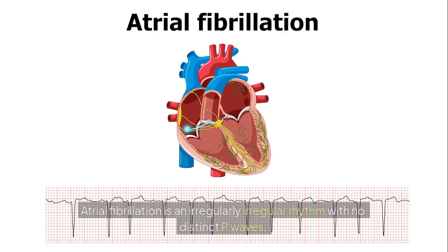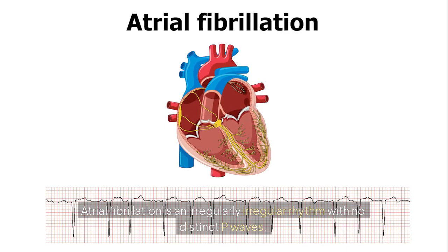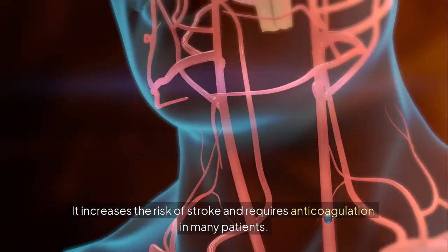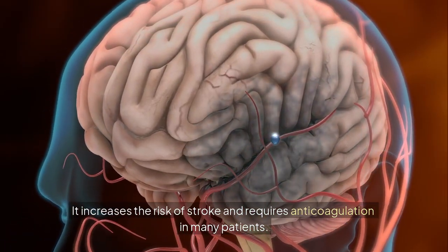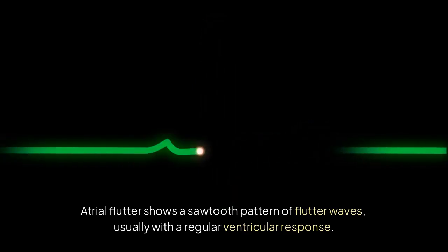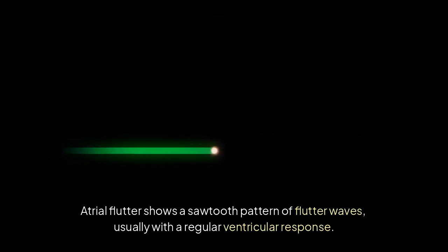Atrial fibrillation is an irregular rhythm with no distinct P waves. The baseline appears wavy or chaotic. It increases the risk of stroke and requires anticoagulation in many patients. Atrial flutter shows a sawtooth pattern of flutter waves, usually with a regular ventricular response.